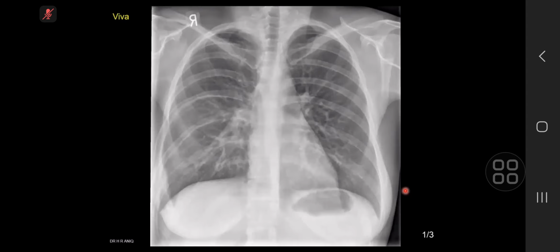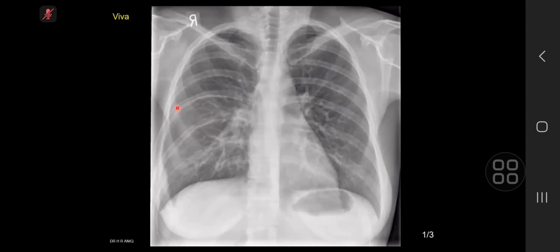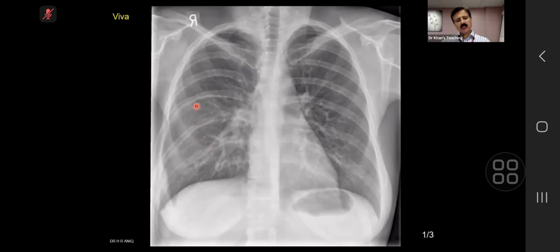There's an area of well-defined periosteal reaction in the right rib of an adult patient. Here? Or here? Yeah. Oh, okay, so it's multiple ribs then. So in an adult, my first concern would be metastases. Actually, this is not a periosteal reaction. Maybe for you it is projecting like that. So let me guide you. There is no periosteal reaction.